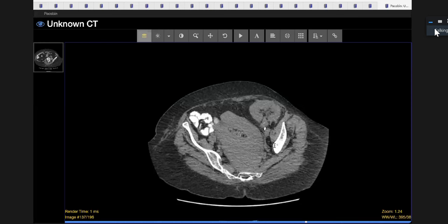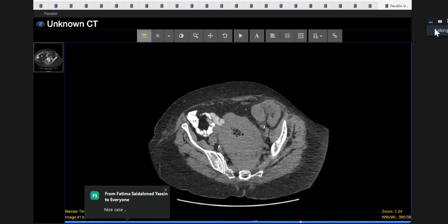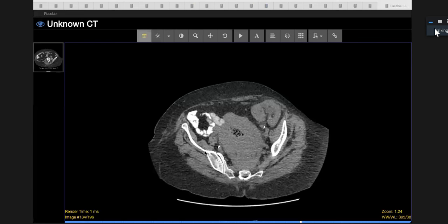Excellent. So you notice, first of all, they don't have kidneys. When a patient has a renal transplant because of chronic renal failure, they don't usually take out the native kidneys, do they? They'll just leave them in. But this patient must have a disease which affects both kidneys and which necessitates them being resected. There are only very few things that could be the cause. Polycystic kidney disease is one, because obviously they get very big, with mass effect. They can also hemorrhage, and they can also undergo malignant transformation, I believe. So they just took them out.